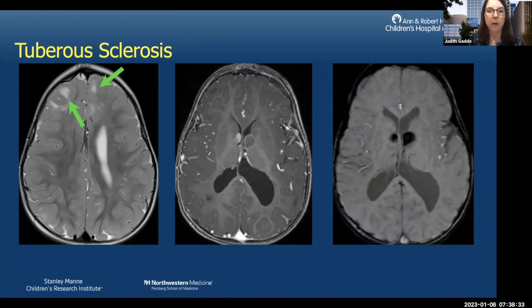So these often will be some of the causes of their epilepsy, and they often will have many and have them bilateral. So it can be hard if they're considering trying to do surgery, but sometimes they will do surgery on some of these if they do a workup and say do a PET and other studies as well, and find that one of these tubers or focal cortical dysplasia are the cause, then they might end up resecting that tuber.